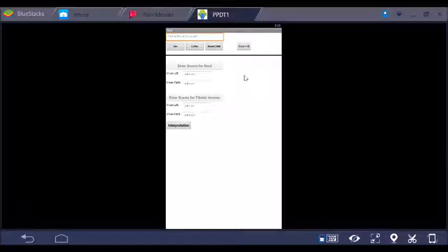This is specifically for people with neck pain using the normative database that we've created over several years. But you'll notice that those two buttons are currently not live. You can't tap on them. Nothing's going to happen. And that's because there are two mandatory pieces you need to first enter before you can start to enter these fields.